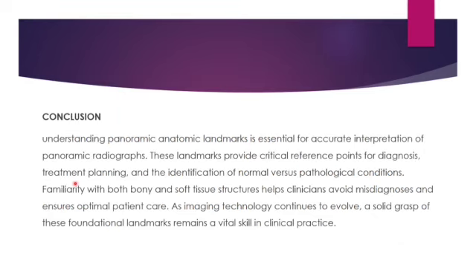So understanding of the panoramic anatomic landmarks is essential for accurate interpretation of the radiograph. These landmarks provide critical reference points for diagnosis, treatment planning and identification of normal versus pathological conditions. You should be familiar with bony as well as soft tissue structures, which will help the clinician avoid misdiagnosis and ensure optimal patient care.